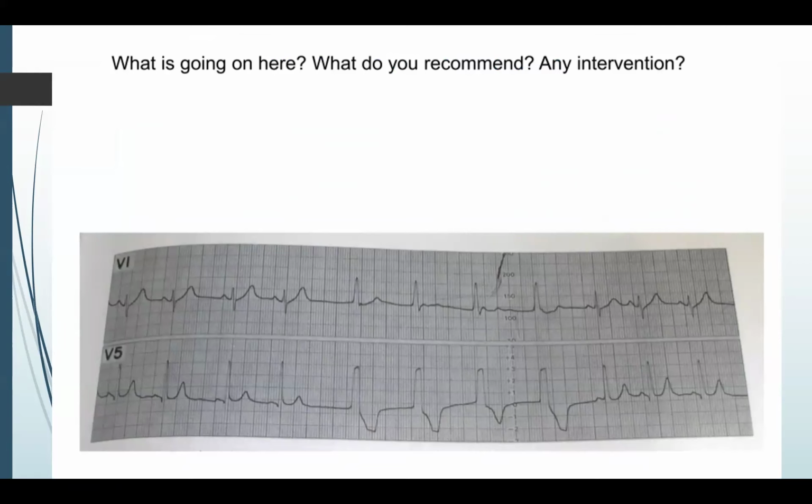All right, so we're looking here at a tracing from an old book. Patient is sleeping. What's going on here? Let's just say, for the sake of discussion, that this is a 14-year-old, and this is seen at 3 in the morning while the patient is asleep. So, Mohammed, do you have any thoughts on what we're looking at here? Good morning, Dr. Pass.